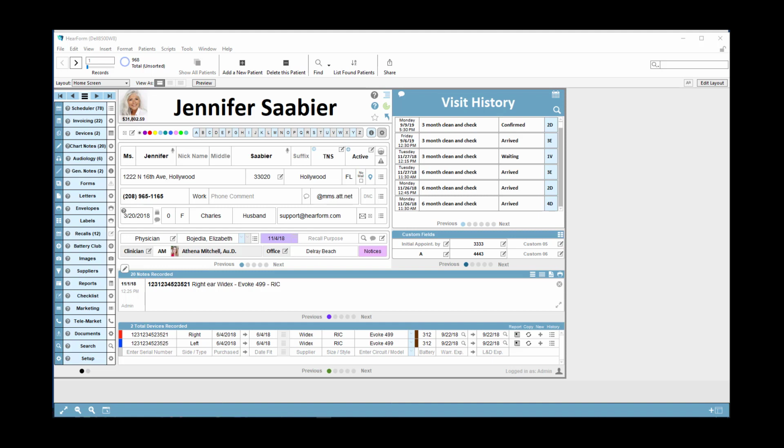Now, you're probably hosting HearForm either as an application using FileMaker Pro 17 Advanced, or perhaps if you have more than 5 users, you might be hosting HearForm with a piece of software called FileMaker Server 17. I'm going to start out by showing you FileMaker Pro 17 Advanced.